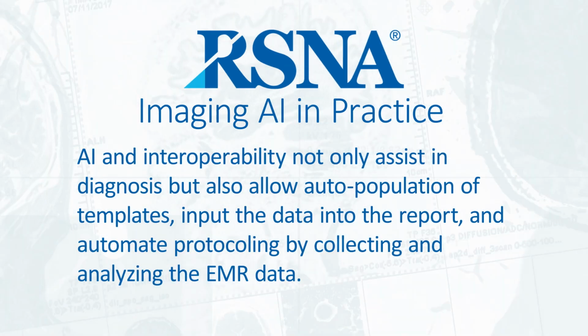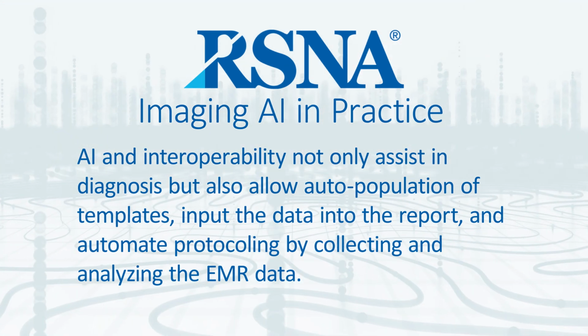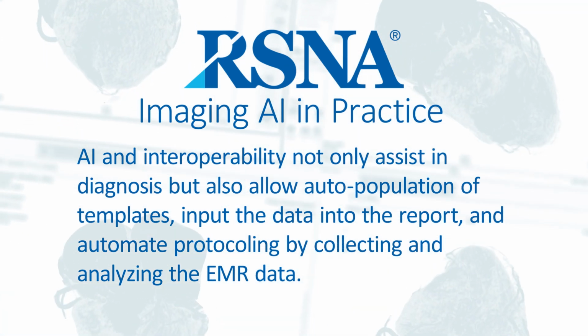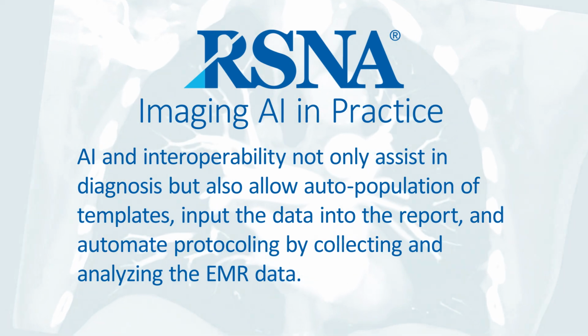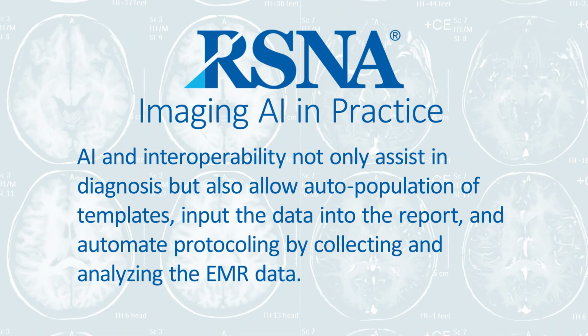AI and interoperability not only assists in diagnosis, but also allows to auto-populate templates and inputs the data into the report, and automate protocoling by collecting and analyzing the EMR data.